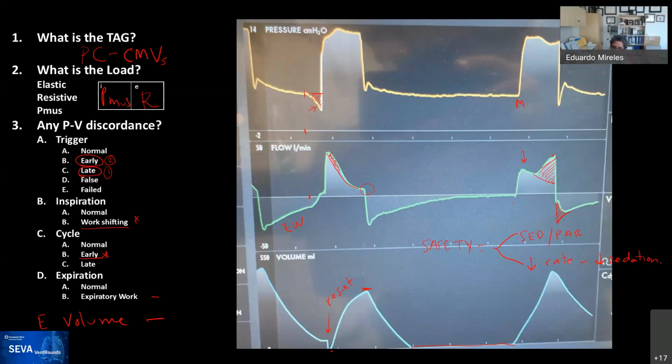So let's think a little bit about this. When you see this, there are a couple of hints that tell you something is happening with this patient. This is a pattern that we saw very often during the COVID pandemic, and we continue to see. But I think you'll get aligned with what I'm going to say now.